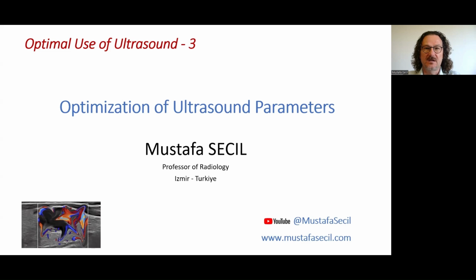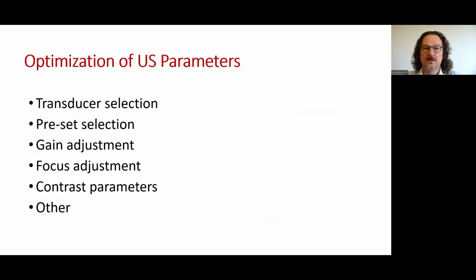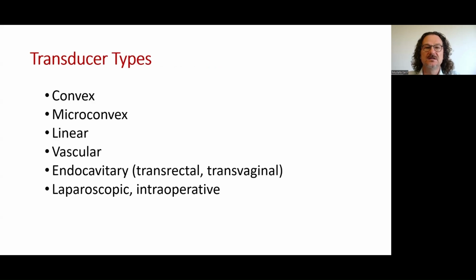This lecture will be about the optimization of ultrasound parameters. I will try to cover transducer selection, preset selection, gain and focus adjustments, contrast parameters, and the others. The transducers may be convex, microconvex, linear, dedicated vascular, endocavitary, laparoscopic, or intraoperative.